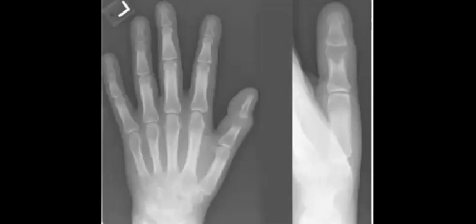It can happen from any tumor, even pleural tumors like fibroma, mesothelioma, cyanotic heart diseases, and cirrhosis. This patient has liver cirrhosis. So the first will be lung cancer, and this one will cause metastasis from lung cancer, and there is some periosteal reaction as well.